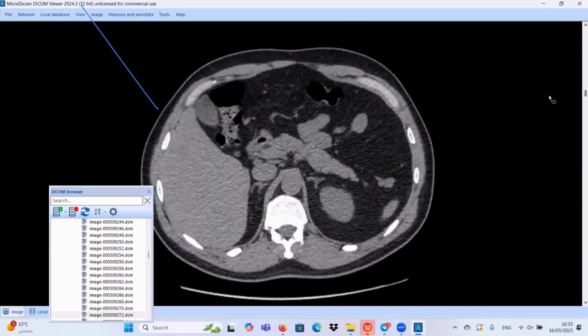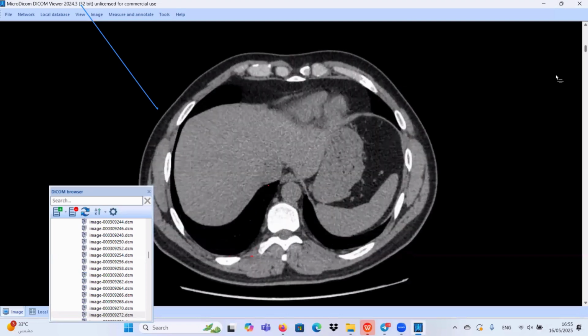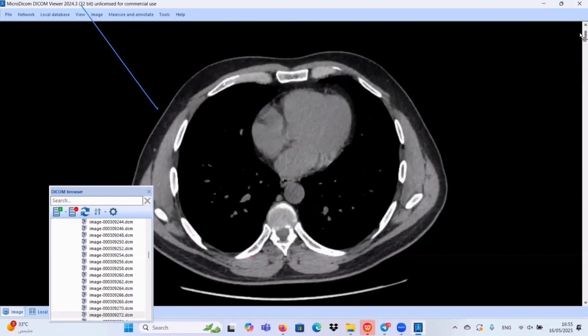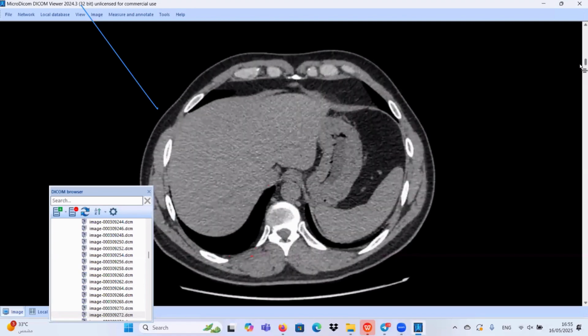Can you go by your own checklist and ignore the history? Ignore the complaint of the patient, because it's misleading. Okay. I will go from up to downward. Both the lung fields, I couldn't see abnormalities. I couldn't see evidence of bilateral effusion.